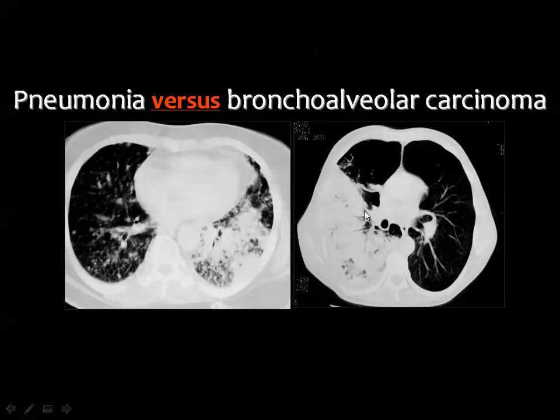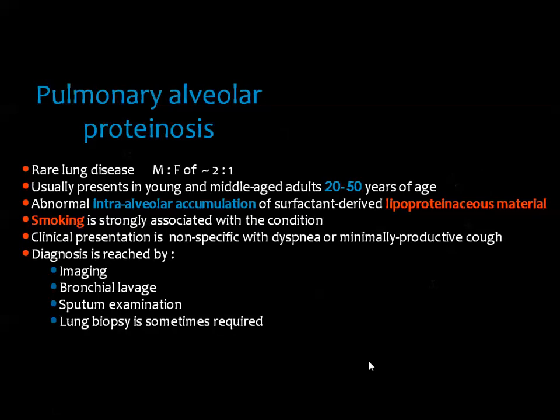And this is the difference between pneumonia and alveolar cell carcinoma. Pneumonia will show an opacity with internal air bronchogram with peripheral distribution, and there are no nodularities in the same lung or in the opposite lung. But in this patient, you can see patchy opacities with predominant central distribution, absence of significant internal air bronchogram, together with the presence of multiple pulmonary nodules in the same lung and in the opposite lung, which are the precursor of these pulmonary opacities.